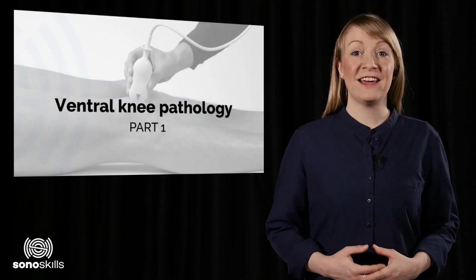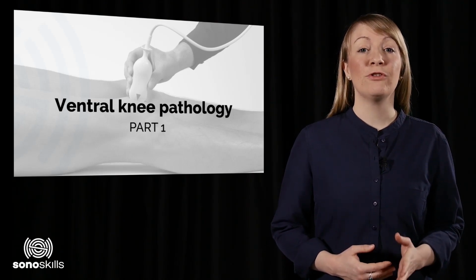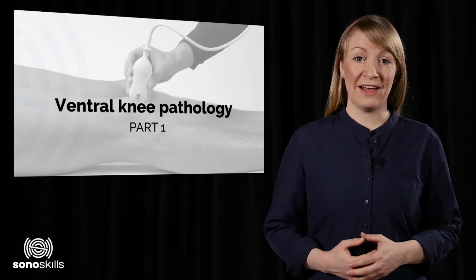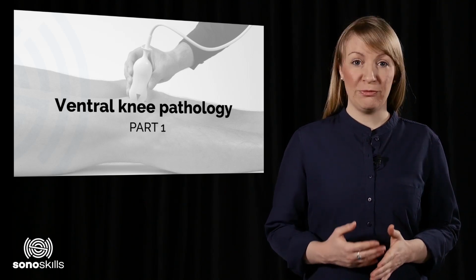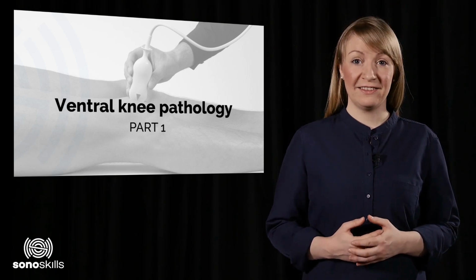The goal of this presentation is to show you some clinical examples of several pathologies of the quadriceps tendon and the patella in musculoskeletal ultrasound. All pathologies presented are exemplary and serve as practice for the pathology checklist.